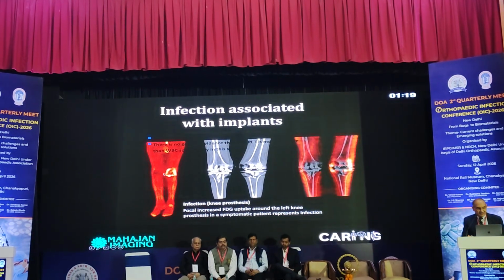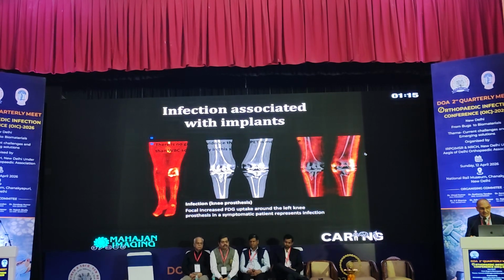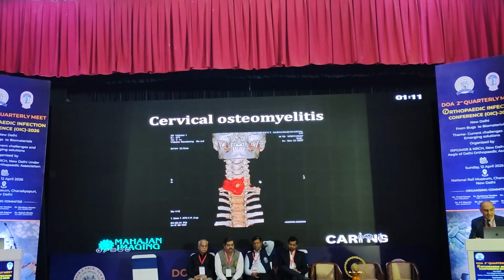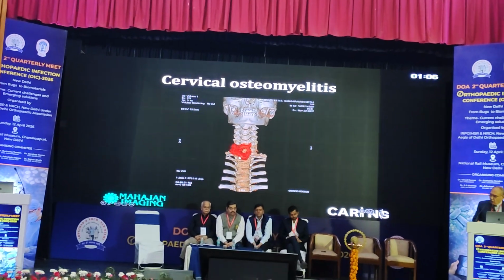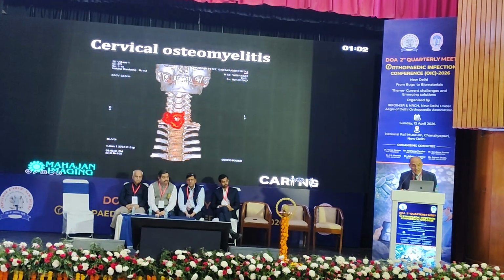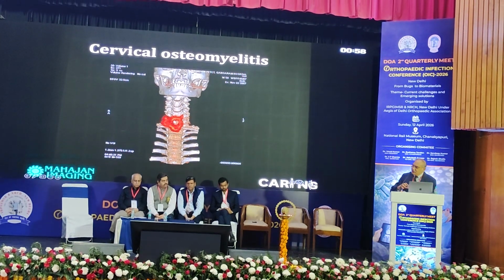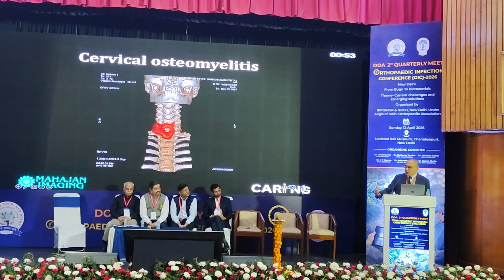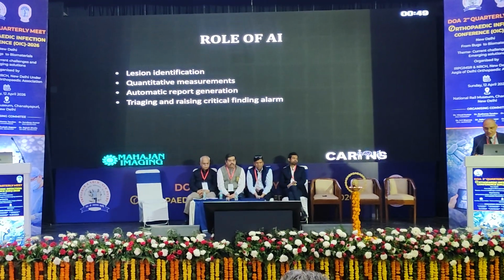Again, yet another case showing the infection on a PET scan, in this case where there was bilateral TKR done. And this is a case of cervical osteomyelitis following surgery, again seen very well with PET-CT. MR in these cases will show you changes, but you're not sure, especially in the immediate post-operative period, whether this is infection or just post-operative change.